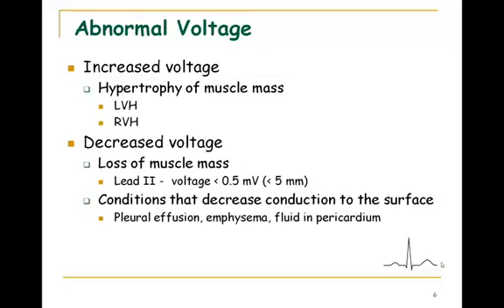The right ventricle never quite gets as big as the left ventricle, so it's going to be hard for you to see the voltage criteria I gave you for high voltage ECG. If you had someone's EKG prior to them getting hypertrophy and then see it after, you're going to see the progression to higher voltage. But if you just had the after picture, you might not know that it was high voltage. But I'm going to tell you one of the ways that you will know that it might be right ventricular hypertrophy.